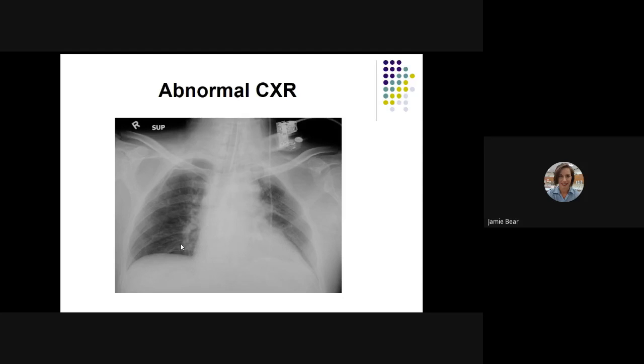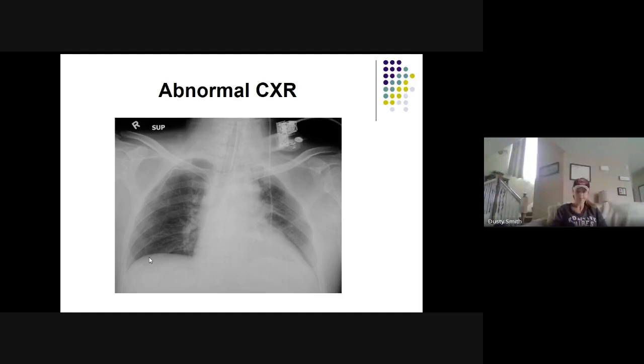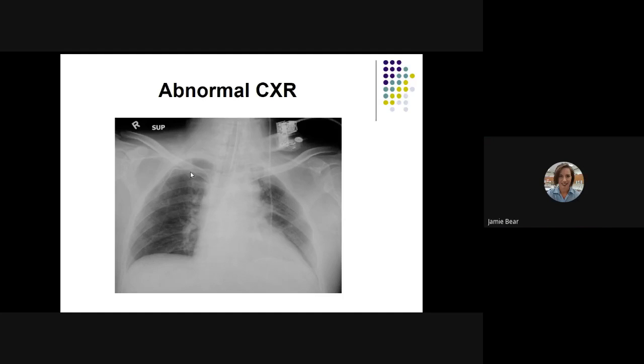Cardiac looks big. The diaphragm is blunted down here. The costophrenic angle is blunted on the left side. Well, yeah, a little bit blunted on the right side as well. Now think about the inspiration here. Is this patient fully getting a good inspiration? In other words, are they fully expanded the way they should be? I would definitely say no. Very good.